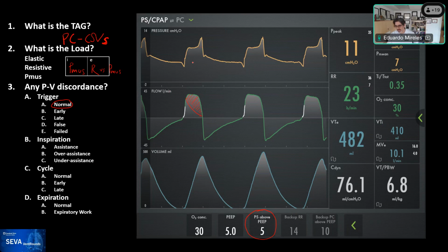Yeah. I think if you were going to say a high degree of over assistance, probably yes, but that's not happening here. Pressure stays above a baseline throughout inspiration. As you mentioned, there are algorithms available now where ventilators or associated equipment can estimate what Pmus is. So you could theoretically compare Pmus with Pvent to see how much work shifting there is. That's not commercially available yet.